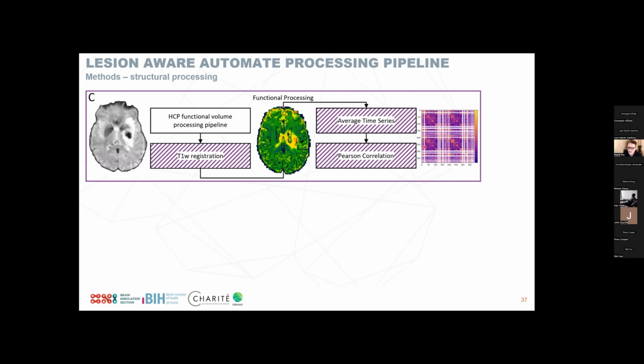As I mentioned before in the beginning, I showed the image of the structural, because here we see these white columns and rows, which is not that something was not correctly computed, but rather those are artifacts from what you've seen before, where we have these areas of the brain that are actually not covered. So we actually don't have the time series data of these regions. So the correlation, of course, is zero, because there's no time series.